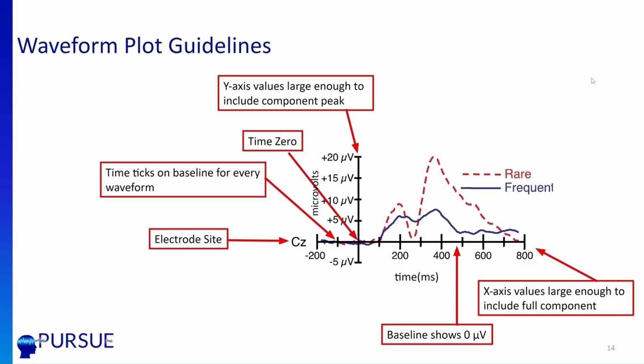The x-axis is located where y equals 0 microvolts. This is also where the baseline is. Furthermore, you need to show if positive voltages are above or below the x-axis. Negative signs must be used to represent the negative voltages on the graph. Plus signs can be used to represent the positive voltages, but plus signs are not exactly required. The voltages should also have equally spaced tick marks on the graph so you know exactly where they are.